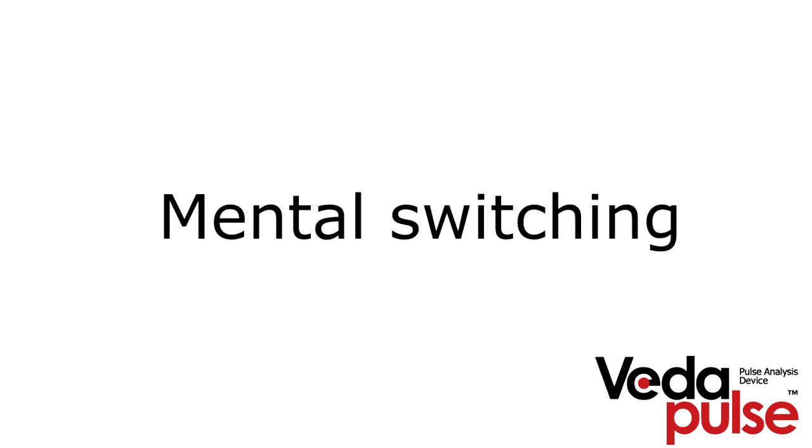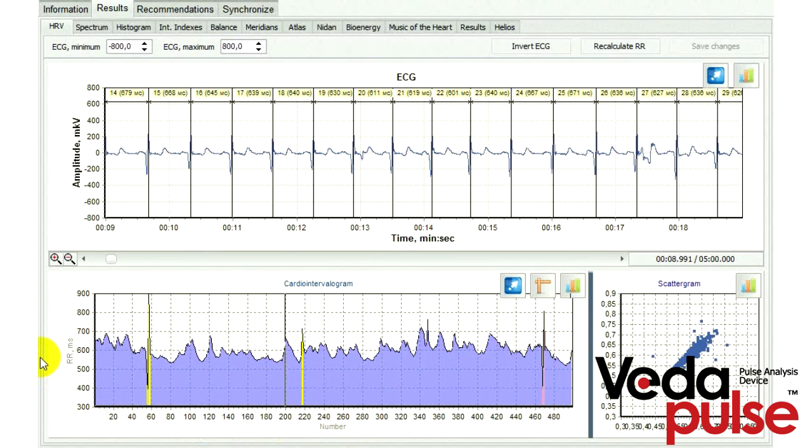Now let's talk about switching to some mental processes, about reactions to external factors and falling asleep, for example. Mental switching is your attention switching. On your screen now you may see two zones of mental switching. Maybe somebody entered the room suddenly, or the patient just remembered something annoying, or some upsetting factors, and his heart rate has changed at this moment. If a person is falling asleep, then we get long drawn heart cycles on our recording.